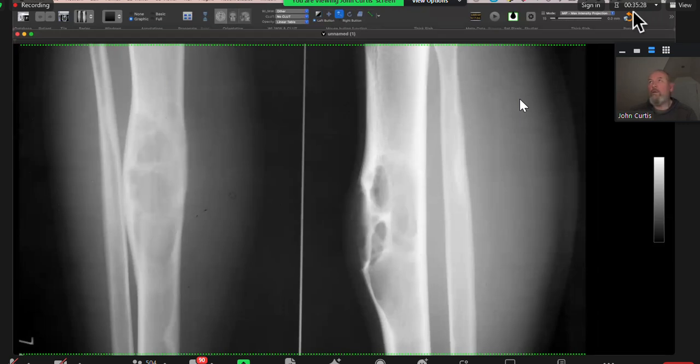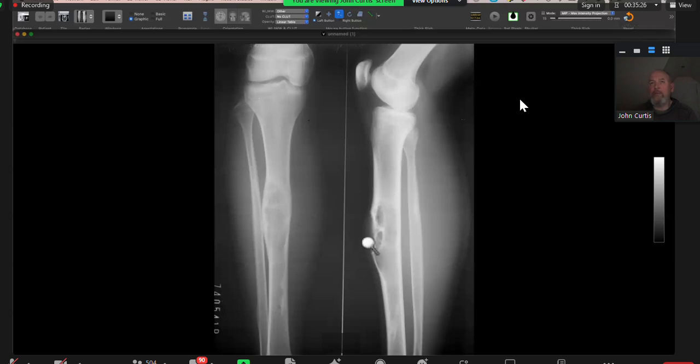Do you know what the diagnosis is in that particular position? If the patient is young in age, I will think about adamantinoma lesion. And do you think the patient's young? No, this is an adult patient. Well, yeah, but do you think the epiphyses have only recently fused? Yeah, I think there is like a physeal line. So I think this is a young patient. So it's an adolescent or young adult, so it all fits. That was an adamantinoma. Yeah. Well done.